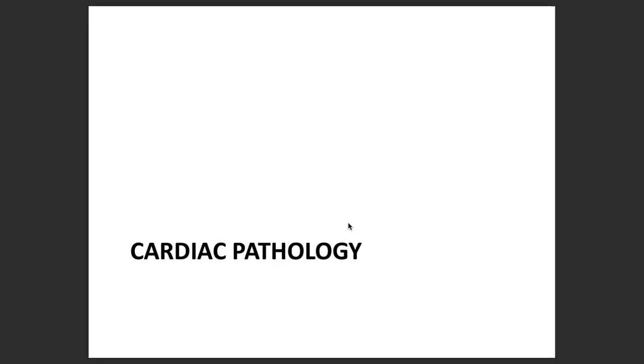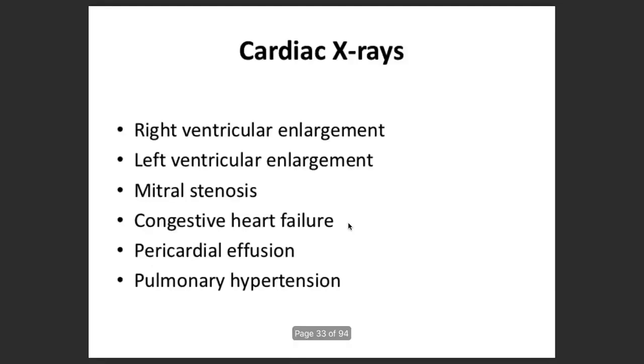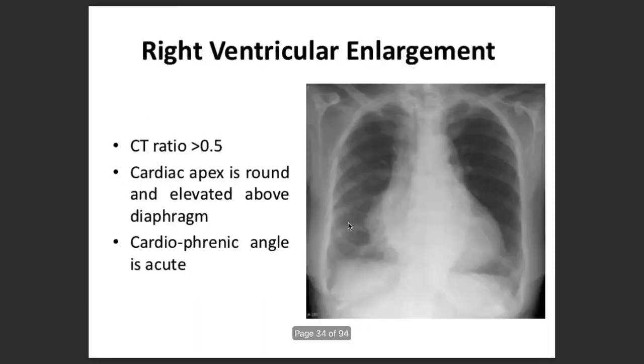Pathological chest X-rays, especially in cardiac. Okay, we all are in cardiology, right? So what tends to happen? These are some of those common chest X-rays in cardiology which we come across. So let's try to have a look.